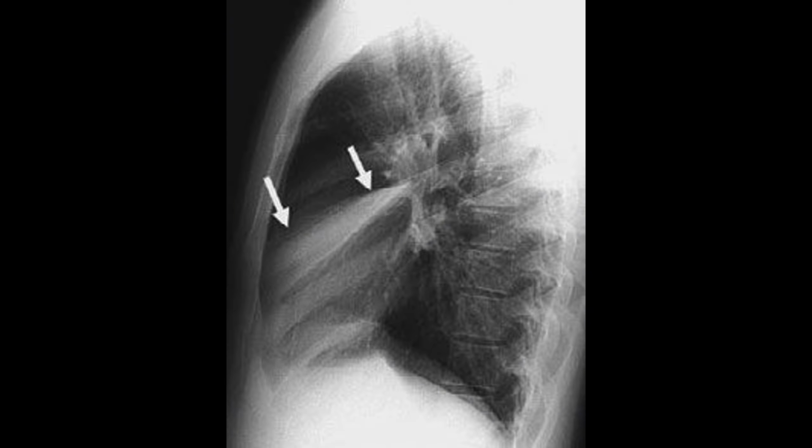On the lateral radiograph, there is a triangular opacity with its apex directed towards the hilum and its base abutting the anterior chest wall, characteristic of right middle lobe collapse. The upper border of the opacity corresponds to the minor, horizontal fissure, and the lower border to the major fissure, which explains why the minor fissure is no longer clearly seen on the frontal view due to its inferior displacement.